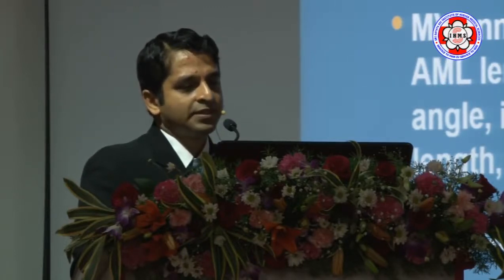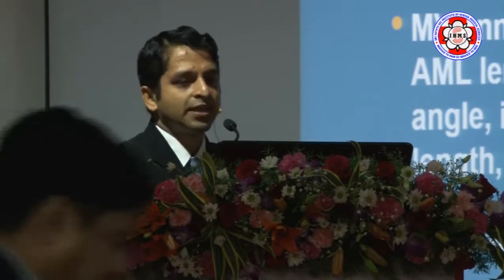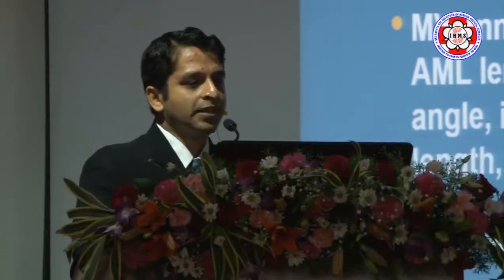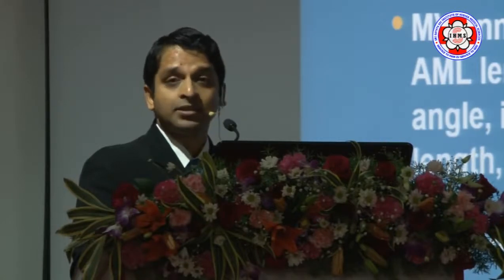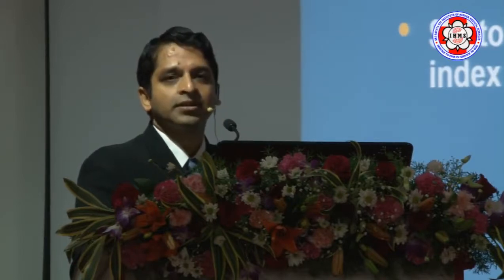And that includes all of these things that I've shown here, but it really varies depending on the etiology of the MR and the particular institute that you're in. And then finally, what's the associated pathology? Not to miss, but things like a dilated left ventricle, we know, for example, that if the left ventricle is dilated, especially in patients with functional mitral regurgitation, then the chance of successful repair is very less. So we would give you that information as well.